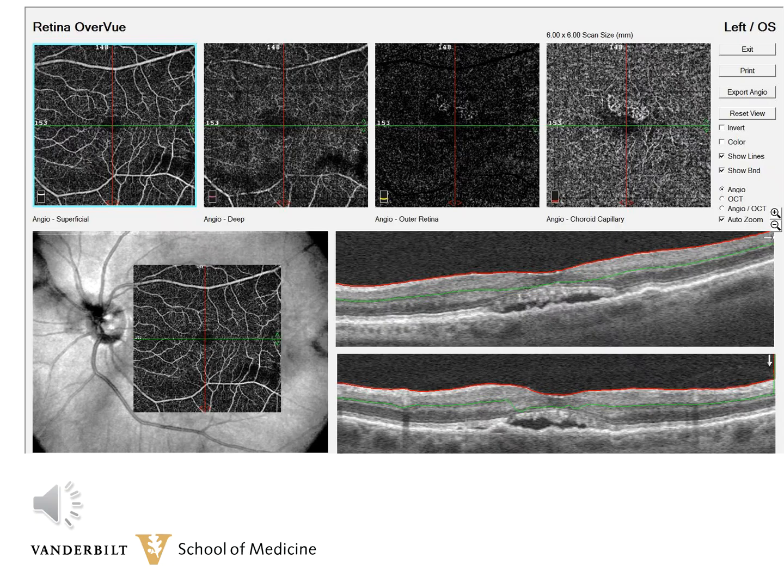For confirmation, we did an OCTA. The OCT shows an irregularly elevated RPE and subretinal fluid and shaggy photoreceptors. The OCTA shows the neovascular net in the choriocapillaris. And that confirms the diagnosis of an occult or type 1 choroidal neovascular membrane.